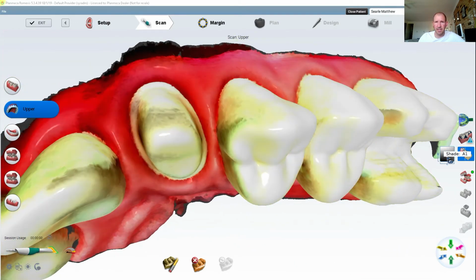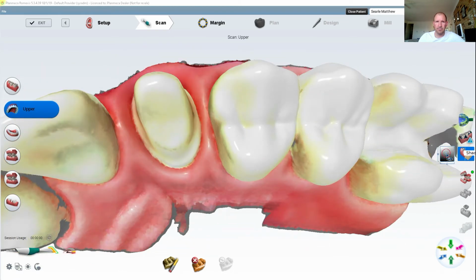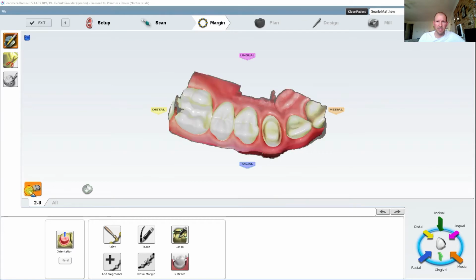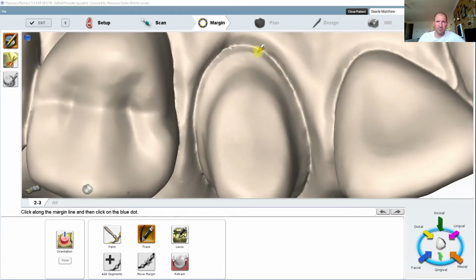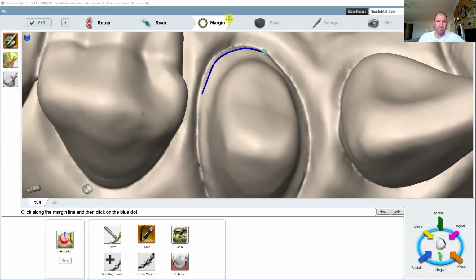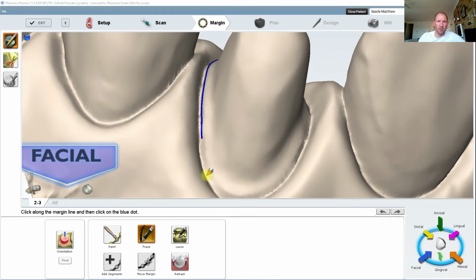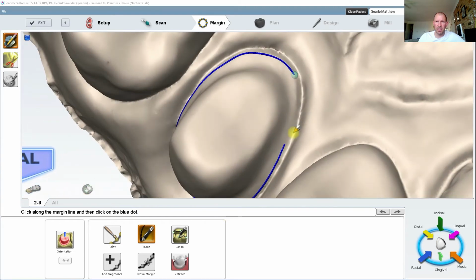So that's obviously me adjusting it a little bit too much. Sorry, and I just got a text as well. So let's just go there, that's fine. And now we're going to go back into this, and then obviously our color, when I bring that in, is the adjusted color that I just did. So we're going to go trace, and we're going to keep to that sharp edge. We can see. I'm going to go a little bit higher, sorry, and I'm just going to show you some tools that you can use in the software.